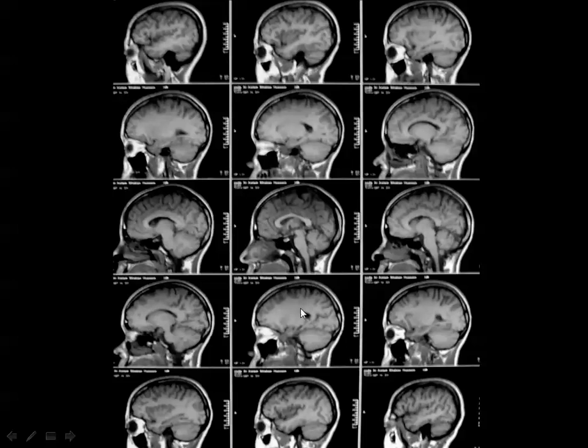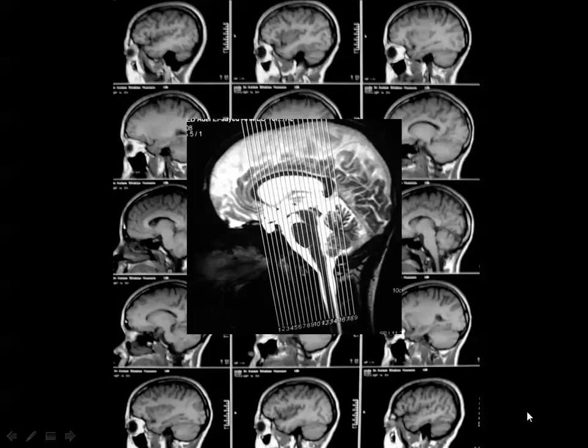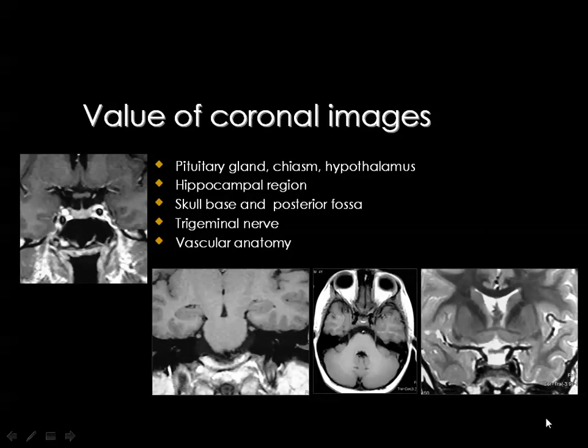But in this image, which is frequently shown in the exams, if this part is annotated and you say that this is the frontal lobe and don't mention left or right, and this is the parietal lobe, this is the occipital lobe, and this is the cerebellum, midbrain, pons, and medulla oblongata. Actually, if you are cutting exactly in the midline, you will see CSF in the interhemispheric fissure, like this T2 sagittal image, and this area is exactly in the midline, and it shows CSF within the interhemispheric fissure.